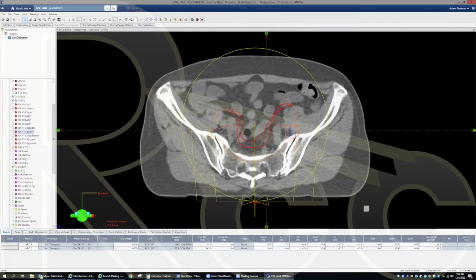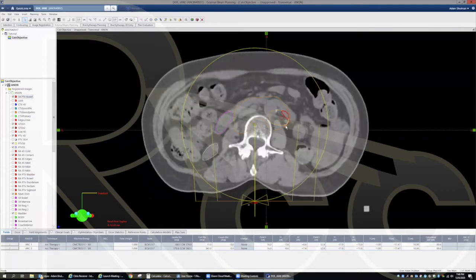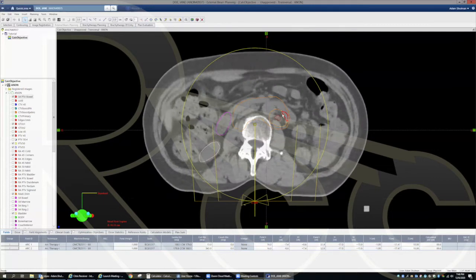Yeah, because you know that they're going to be below tolerance because of the doses you're going. Okay, so it's up here, I think. For example, I think this doctor only contoured this bowel loop here. I don't even know where it is on these structures. I'm sorry, it's somewhere. No problem. It makes sense because of the doses that you're going, so you know that you're going to be under tolerance. Exactly. So this one, I think the doctor just wanted to keep the max bowel loop to 55.